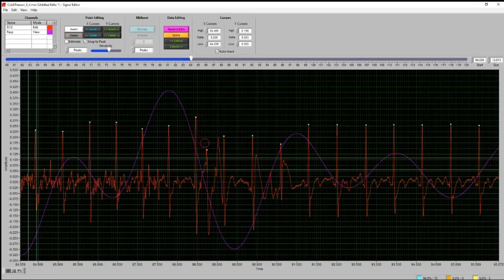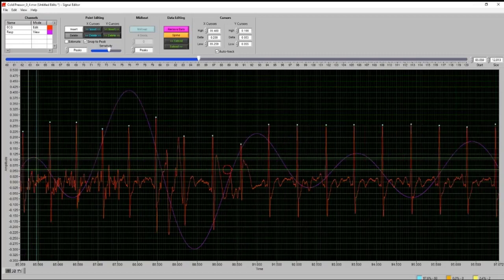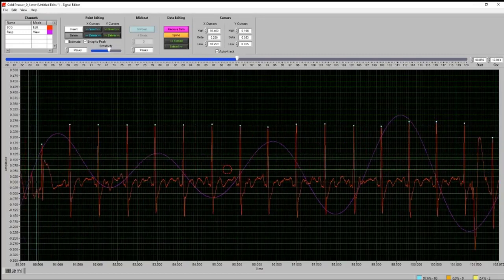And so once again, we can see we have a motion artifact here. This is a sort of distorted T wave. And really, this one doesn't look too bad. I mean, we don't see any similar structures that can confuse us or confound which one is the actual beat. So really what we need to do is remove that one artifact. So sometimes it looks a little daunting and it ends up being pretty simple.